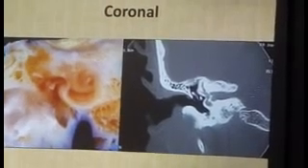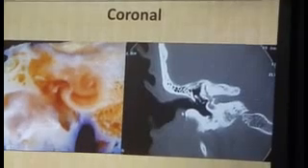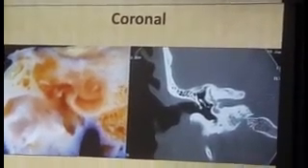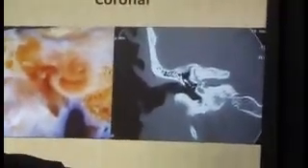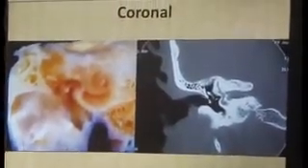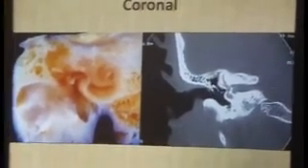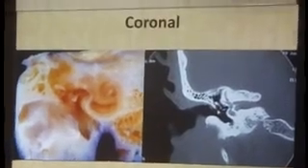And now we come to another more important structure, which is better visible on a coronal scan rather than on an axial scan, and which is this one. And that is the lateral attic wall or the scutum, again more liable to erosion in localized cases of cholesteatoma. So when you are dealing with a localized case of cholesteatoma, you need to see whether there is acute angulation between the external auditory canal wall and the lateral wall of the attic, whether there is any erosion or not.